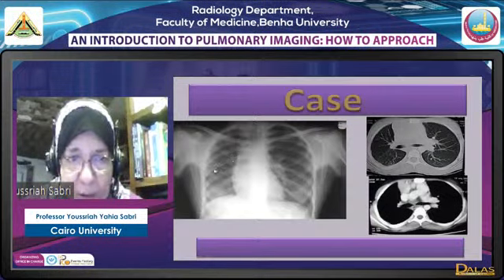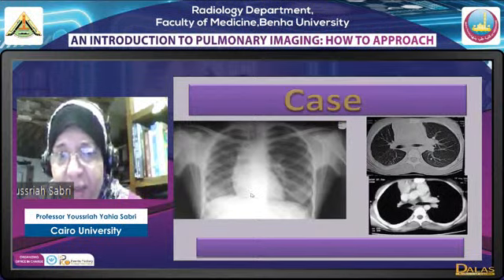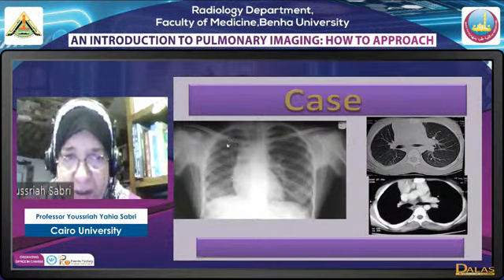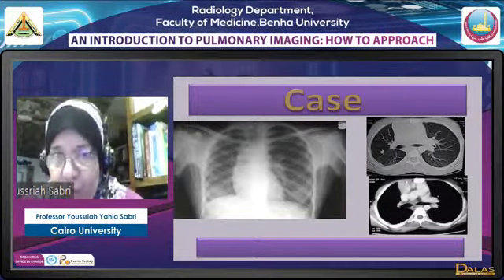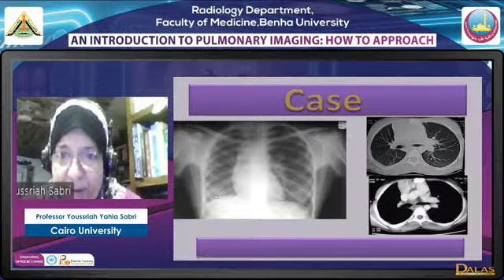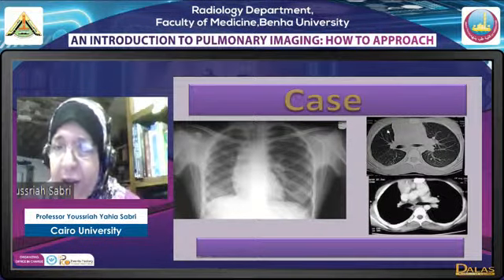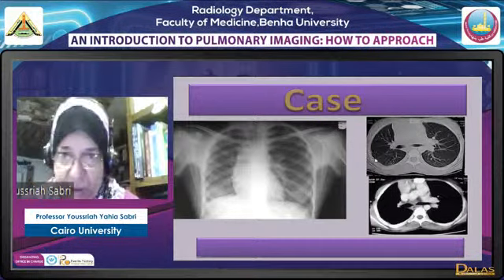Now what do we have here? We have a small lung on the right side. We have shift of the mediastinum and heart. We have abnormal configuration of the mediastinum and heart. This is a child actually. You can see the epiphyses here. Now, is this lung only small or is it hypovascular? Well, compare the vessels in the axial images on both sides. You will find that the lung is small and hypovascular, and actually there are some abnormal vessels posteriorly.